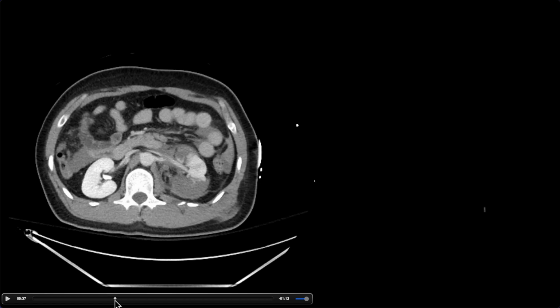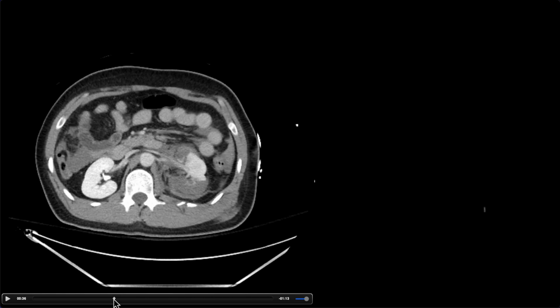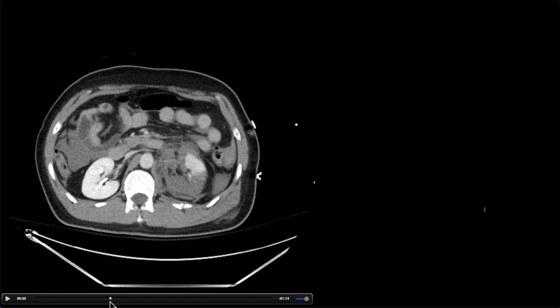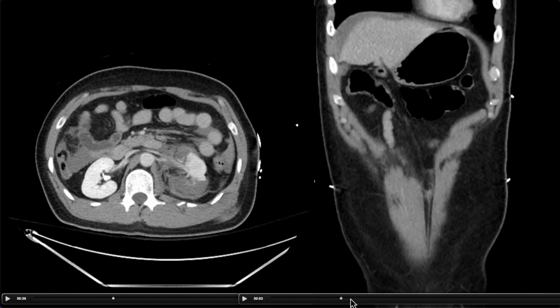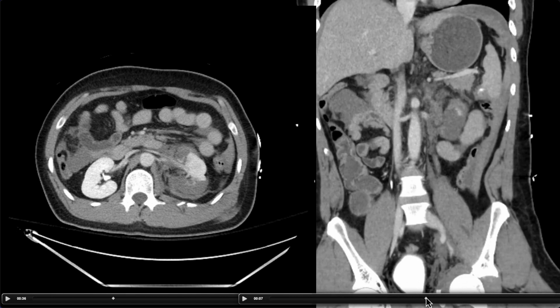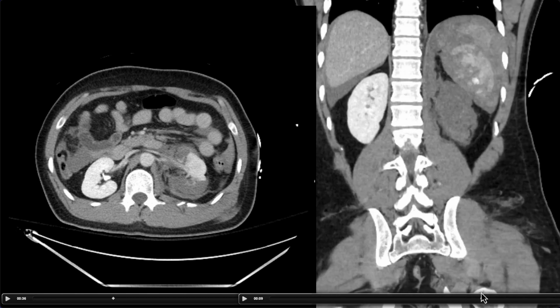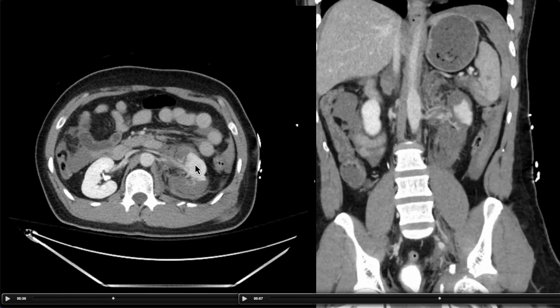Let's take a look at the renal artery. So that renal artery comes out here, and even though this is just a portal venous phase, we can see that it almost looks like it abruptly cuts off. Maybe there's a little bit of branching to that upper pole, but not much at all. And so this is an important mechanism of trauma, which is a renal artery pedicle stretch injury, often due to rapid deceleration in the setting of motor vehicle accident, and that can cause stretching. The kidney can basically move and have a shear injury along its vascular pedicle, which stays relatively fixed, and that can cause dissection and tearing of the renal artery and infarction.